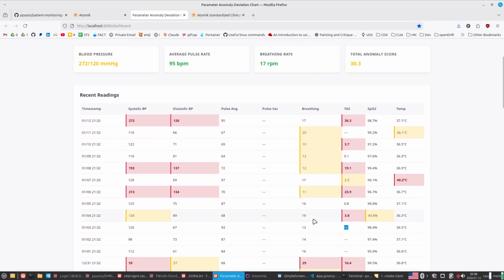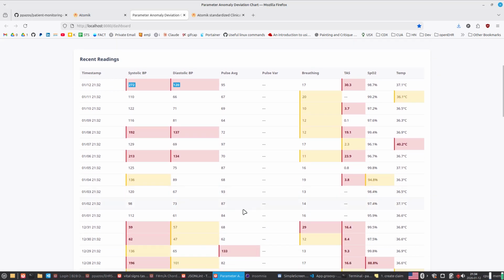And we also did simpler rules here, like if the data you see here, for instance blood pressure, is outside the normal range, we show red, and if it's far away from the normal range, it is red. If it's borderline, near the line, it will be shown as yellow. And if it's okay, it will just show white. We can customize that, of course.